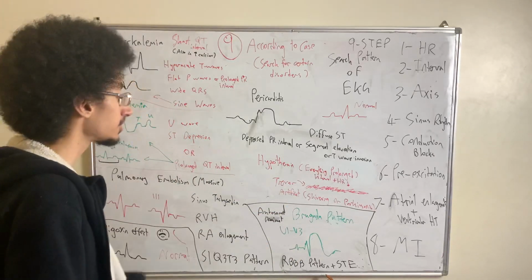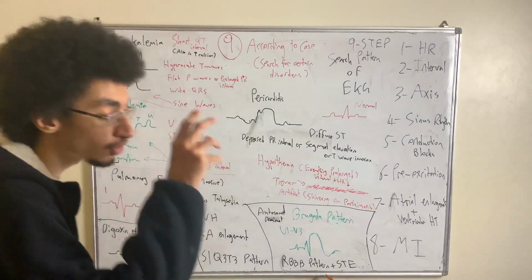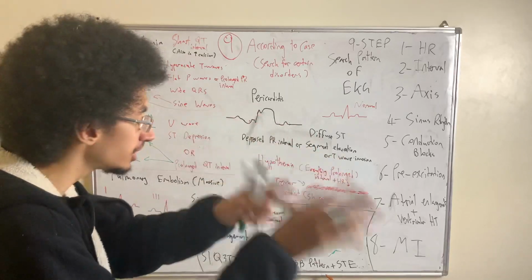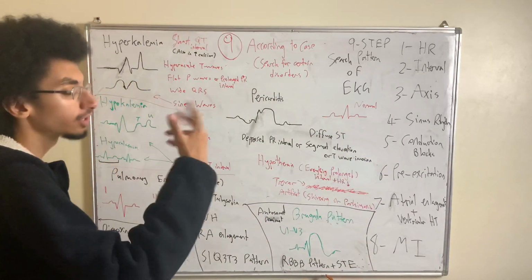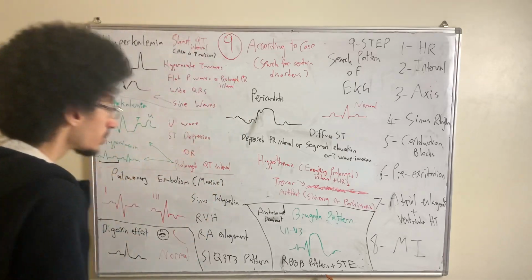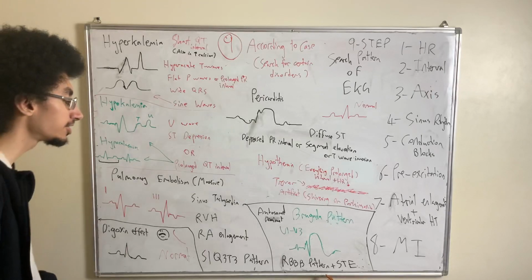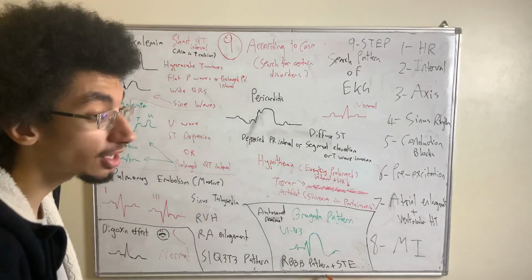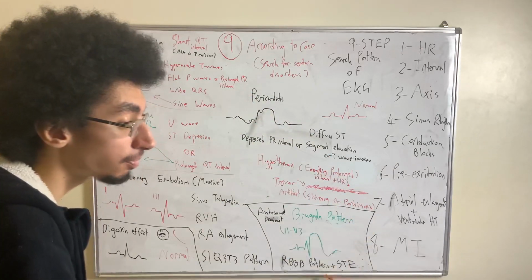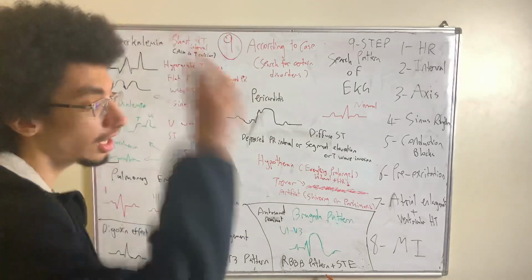Now Brugada is an autosomal dominant disease in young males, where there's a problem in the repolarization of the conduction system of the heart. If you look at V1 to V3, you might see something that resembles a right bundle branch block, where there's a widened QRS and a tall R wave.